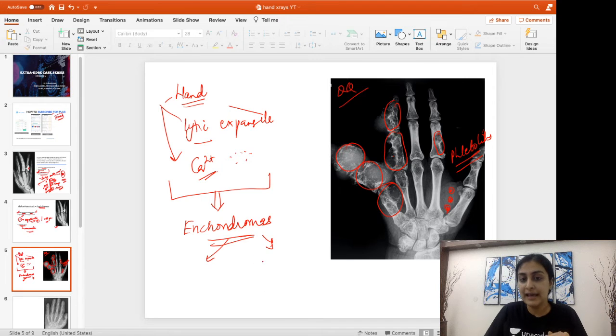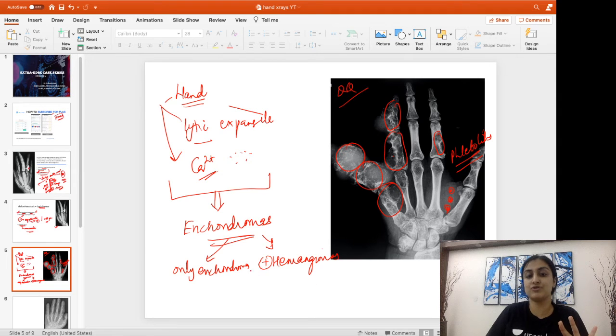So remember, guys, enchondromas plus hemangiomas, or enchondromas minus hemangiomas means only enchondromas, multiple enchondromas but no hemangiomas. What do I call it? So O for only enchondroma, it's Ollier's disease. Alright, so multiple enchondromas can have two syndromes. If there are only enchondromas, we call it Ollier's disease. If there are multiple enchondromas in addition to multiple soft tissue hemangiomas, we call it Maffucci syndrome. Alright, so remember these names, guys.